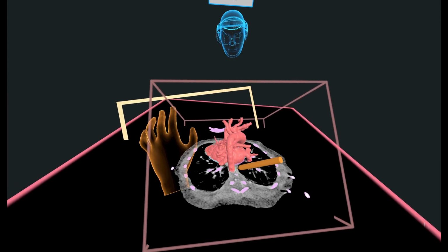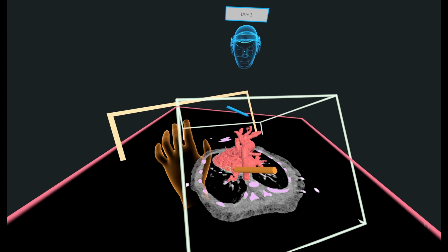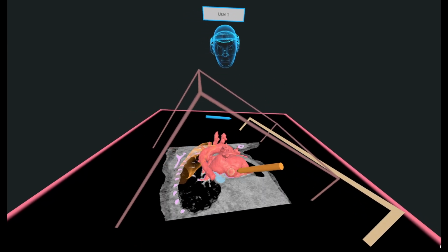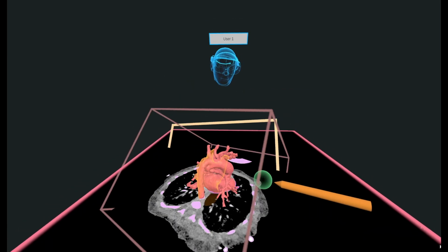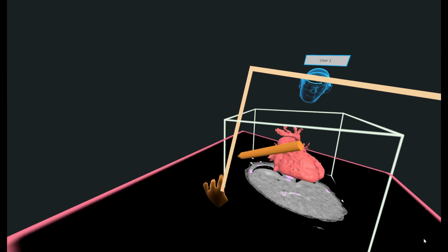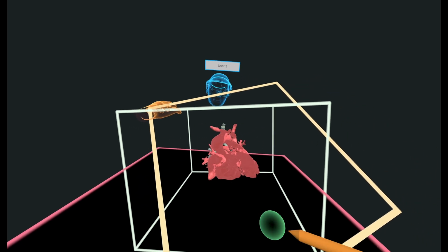This is just critical as we're having this very complex anatomy on this patient. Let's segment more towards the lung. This is very important to understand a lot of the anatomy, pulmonary veins, pulmonary arteries, and that very tortuous ductus there. All right, so I'm going to show now the airway and the complex heart. I'm going to crop through and just see the anatomy.